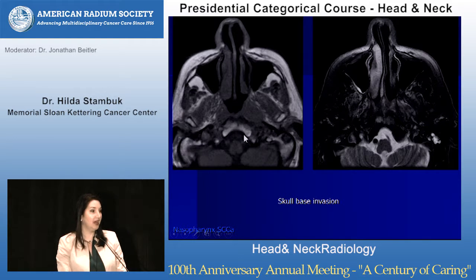And the beauty of MRI in this scenario is that in adults, the marrow is fatty white. And when you see tumor infiltrating, you see ventrally, here's the asymmetric mass, there's a primary tumor. You can see gray tumor infiltrating the fatty white bone, and this is why I love pre-contrast T1 weighted imaging when I'm looking at head and neck cancers, particularly in the bone. Sometimes if you're lucky, the tumor infiltration can be T2 bright, but I wouldn't depend on it. But do notice that they do have opacification of the mastoid air cells.